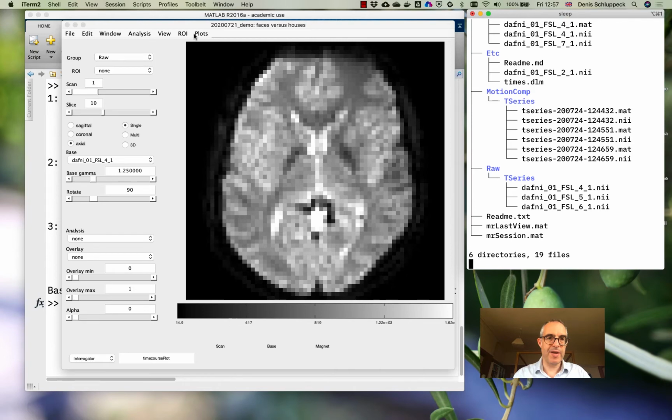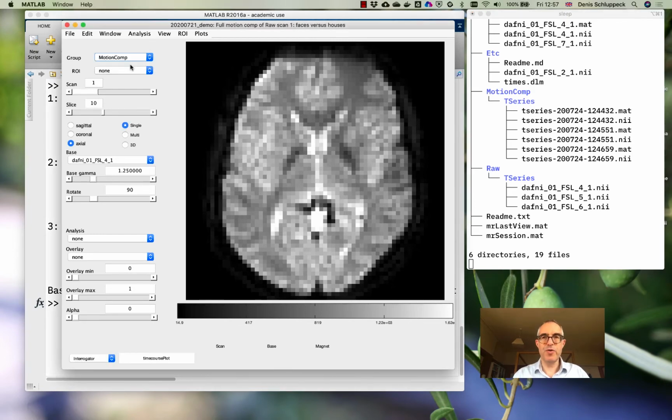So what do I mean by that? One thing, for example, that we could look at is how much motion compensation was actually done between frames. That information is not stored in the images, but it's information that needs to get stored in some other data structures, right?